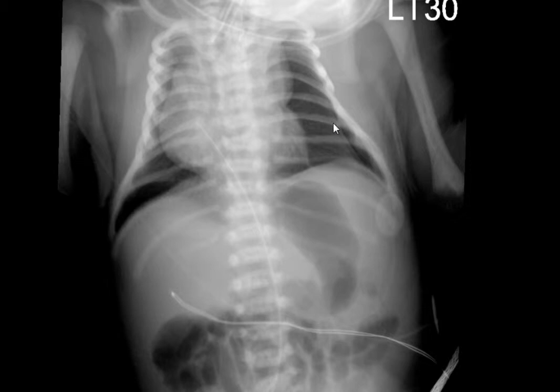You can see the visceral pleura laterally and maybe subpulmonically, but this whole area is too lucent and this heart and thymic border are much too sharp. So these pneumothoraces are both a lot larger than you initially think looking at the radiograph.